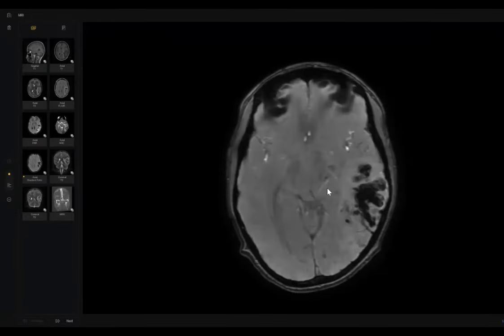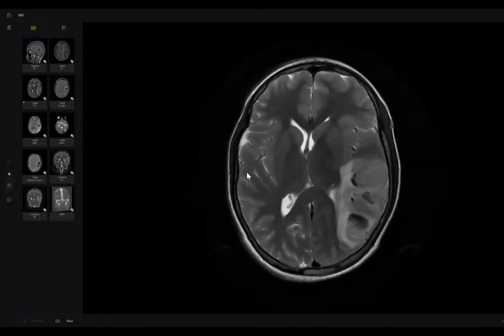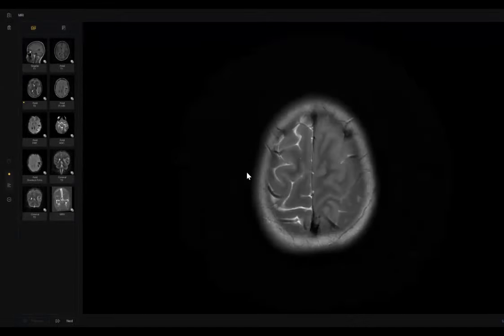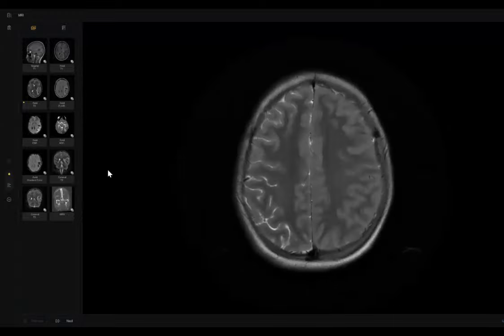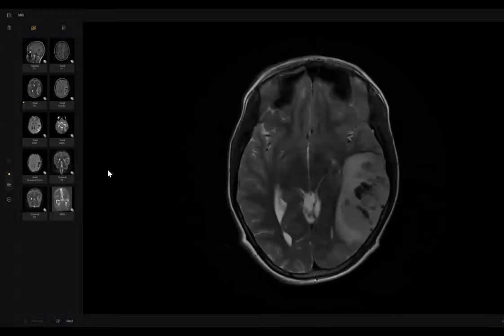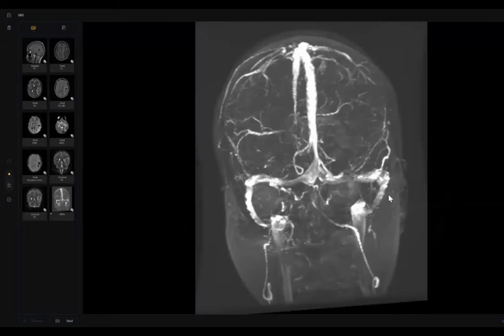We are in a big doubt about hemorrhagic infarct. So it must not be a large dural sinus thrombosis, because the large dural sinuses are all patent. It may be a cortical venous thrombosis that is not showing here and just showing here by comparison.